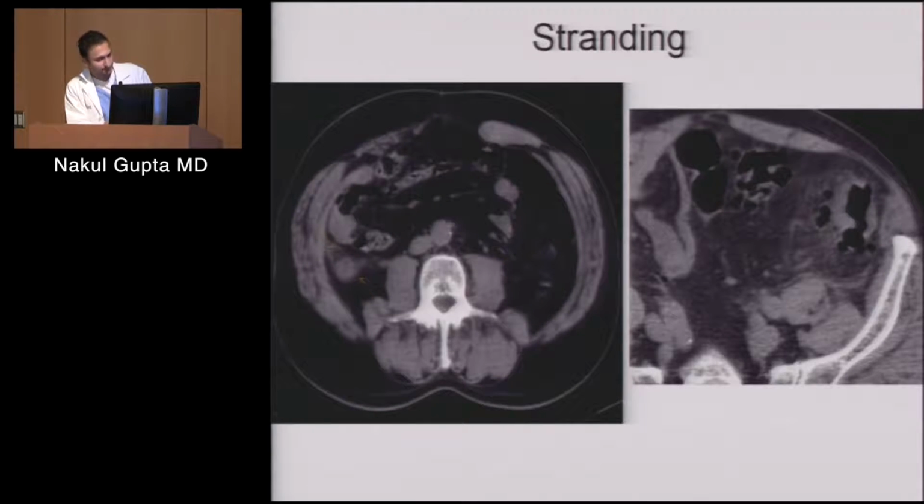Around that appendix. Same thing, diverticulitis here. You have a section of sigmoid colon, multiple diverticulae, and the fat. Look at the fat around it. So it's very gray as opposed to being black. So this is fat stranding, a sign of, in this case, diverticulitis.